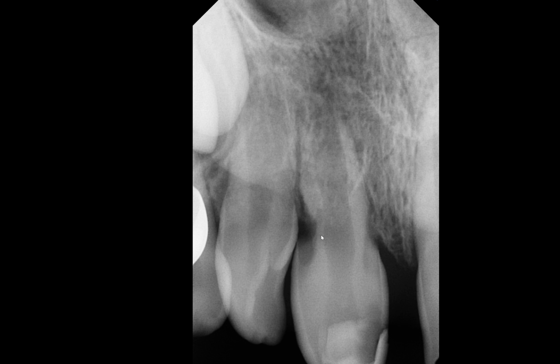Another clinical piece of information that I can give you is this tooth has class 1 mobility. So with this mobility, cervical resorption, short root, and compromised crown to root ratio, obviously the prognosis of this tooth is not very good. Not to mention there's a large carious lesion which at any moment could be involved with the pulpal space. So great case to discuss.